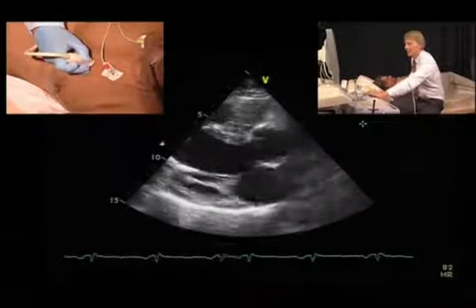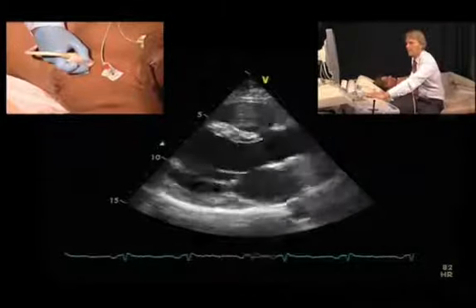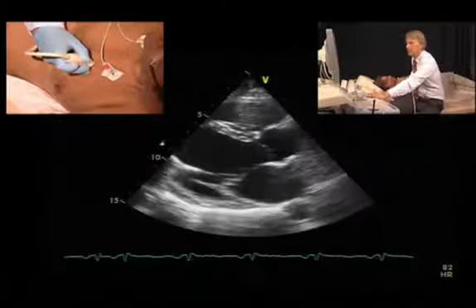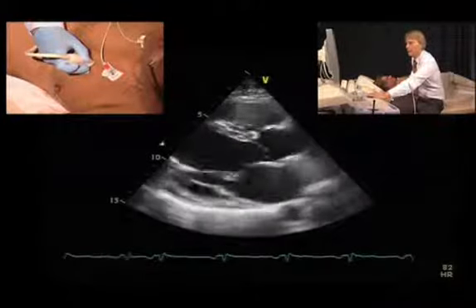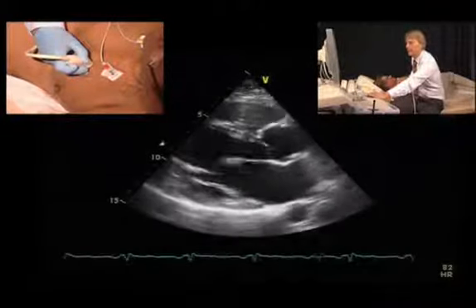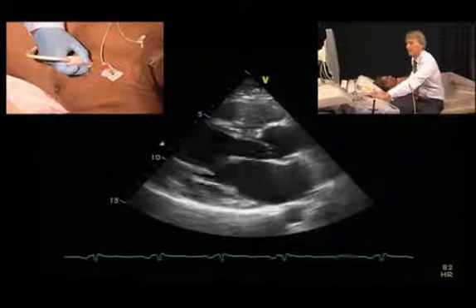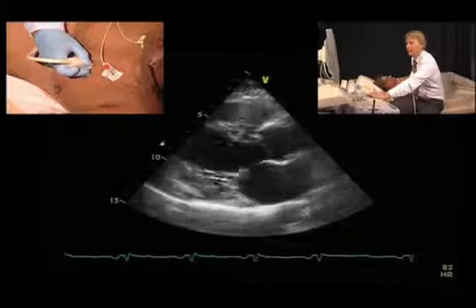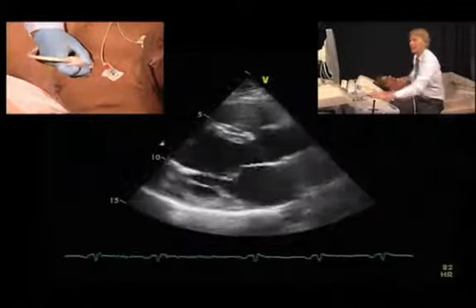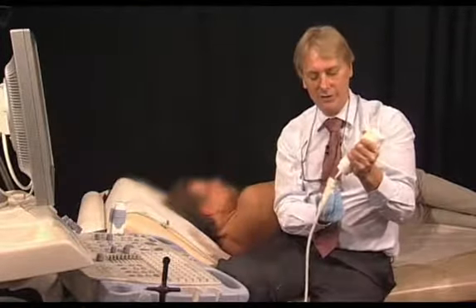appreciate that there is fibrosis of the subvalvular apparatus, which extends here into the papillary muscle and also into the posterior mitral valve leaflet. You can see that the posterior leaflet is restricted in its motion, and we can expect at least some degree of mitral regurgitation in this patient. But the real interesting or real typical findings for endomyocardial fibrosis are usually seen in the apical views.